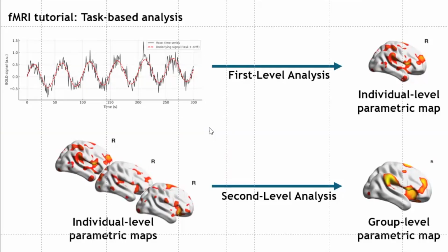So you take all the subjects, there are 26 subjects, and you do a contrast between the 26 incongruent parameter estimate images versus the 26 congruent parameter estimate images. It's a t-test, in fact.